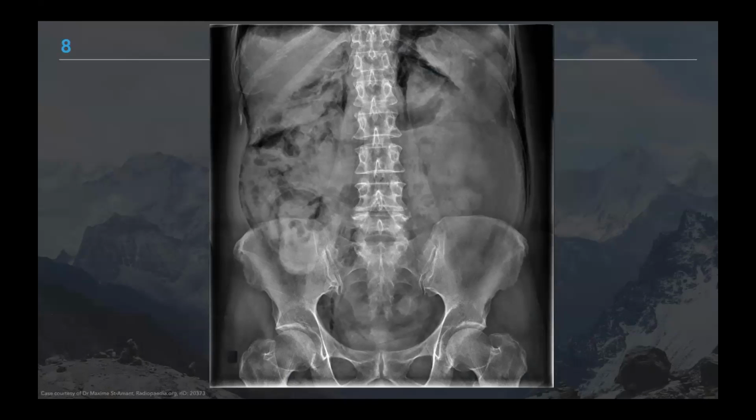I've deliberately used this one because it's a bit difficult. And I don't think you'd be expected to get the answer. But if you see something like this, something trickier, A, it's usually a sign that you're doing well because they're showing you something harder. And B, it's because they want to see how you cope under pressure or in the context of something you're unfamiliar with, which is why having a structure is so important.